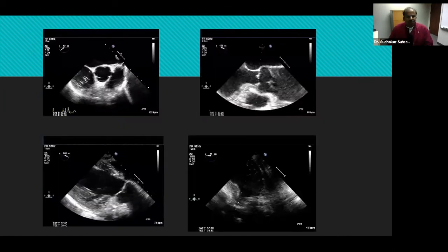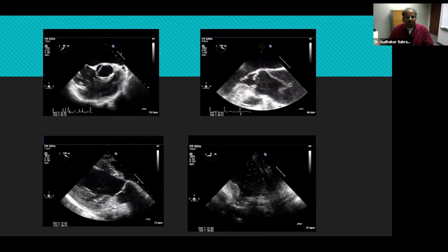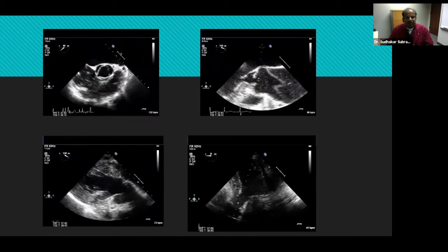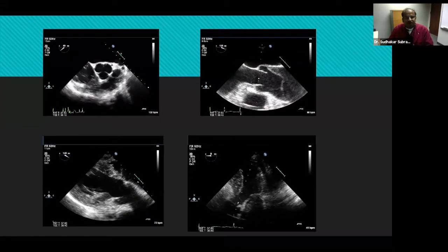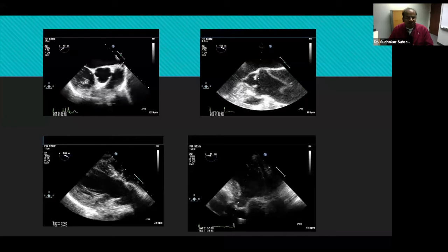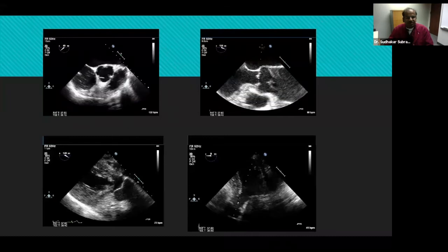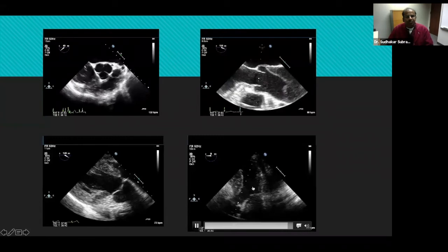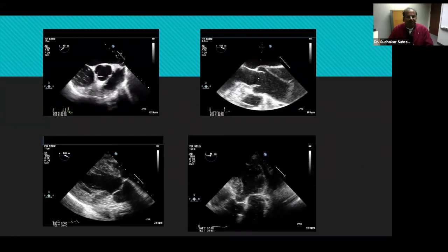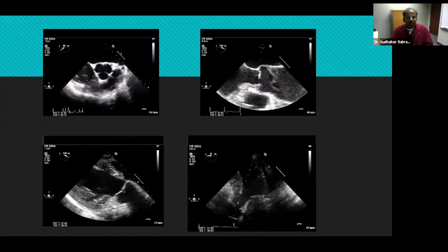As our previous speaker talked about the overview of anatomy of the aortic valve, you should be familiar by this time with the commonly used views, starting from the left top: the mid-esophageal aortic valve short axis, then the long axis, and then in the gastric, commonly we use either a transgastric long axis or the deep transgastric long axis. So we are going to use pretty much 3 out of these 4 views for qualitative as well as quantitative assessment of aortic valve disorders.